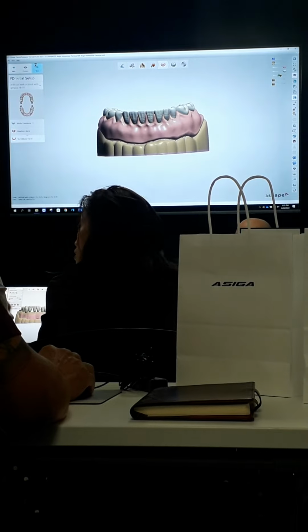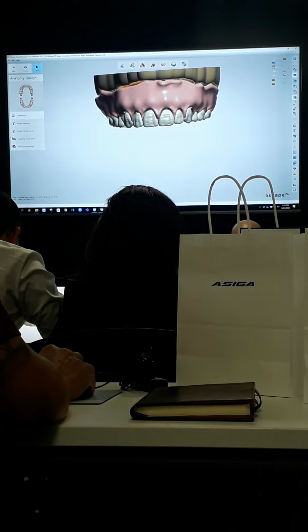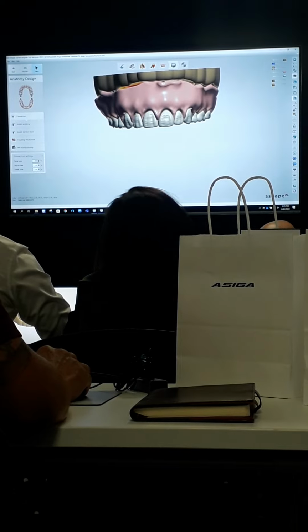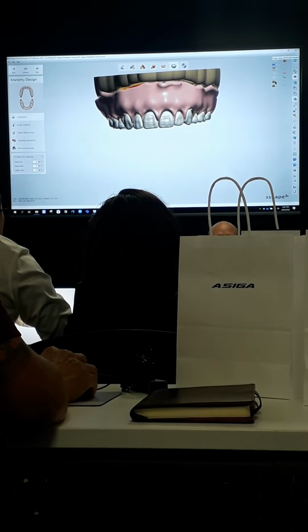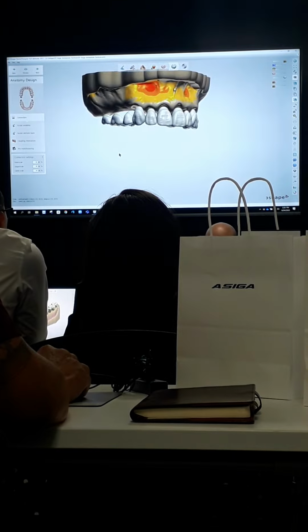So once you generate your gingiva bases and you're happy with the way they look, you'll hit next again, and this will take us into our last few steps here. The first step is the one I mentioned where we have to put connectors in between the teeth because they are all bridged together.